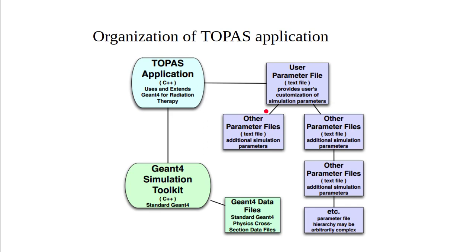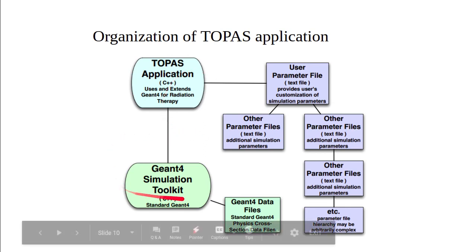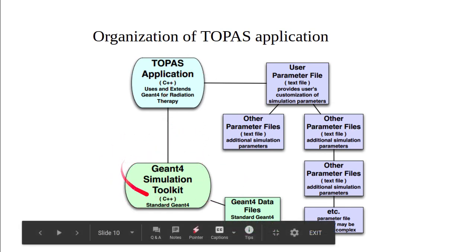Now let's see how your TOPAS application is organized. Basically TOPAS is developed over the G4 simulation toolkit, and the G4 simulation toolkit uses G4 data files.